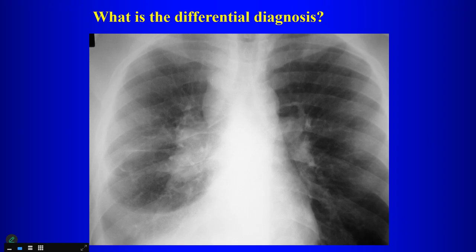What's abnormal in this chest radiograph? Pleural effusion and right hilar lymphadenopathy. Yeah, so there's right hilar lymphadenopathy here. What about the right paratracheal region? Also mediastinal lymphadenopathy. Yeah, so there's right paratracheal lymphadenopathy also. So if you're looking at a chest x-ray like this, what's your differential diagnosis?